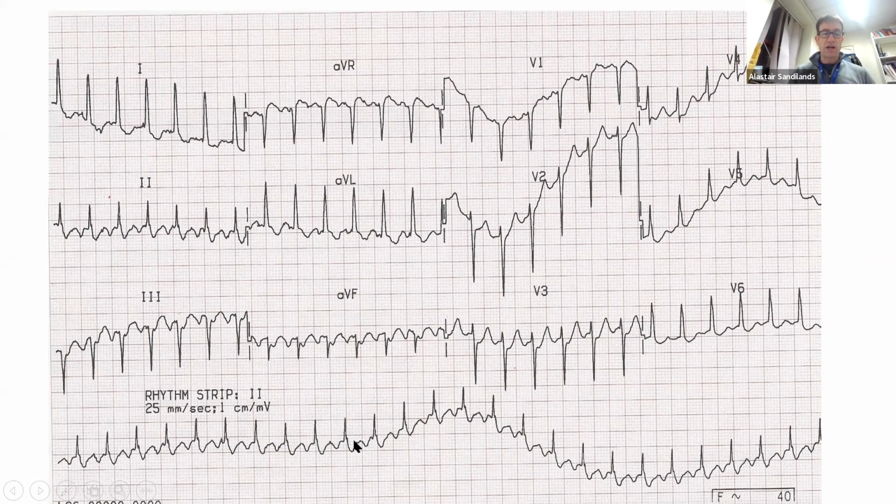And it's 2-to-1 conduction. So we know that 300 beats is 1-to-1. Every flutter wave is 300. This is going 2-to-1 because there's a rate of 150 between the QRSs. You don't necessarily need to say that, but this would be an ECG of a regular narrow complex tachycardia with flutter waves in the inferior leads, indicative of atrial flutter.